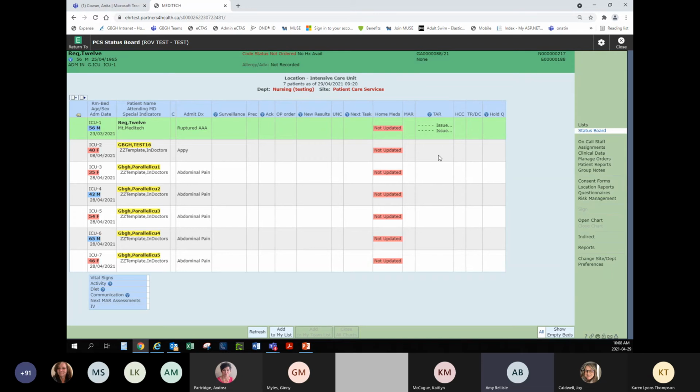What they will take with them in New World and future is the lab labels, because we won't have that chart. I mean, there will be some sort of chart in the inpatient world as well, but for identification for that patient, we need the name, date of birth, sex, etc. So we need to take that sheet of labels down with us. Once we have come back up, we've done our verification in lab back with them, and we've done our signatures, lab will flip that status to issued.